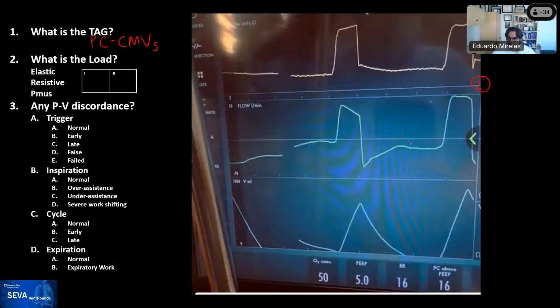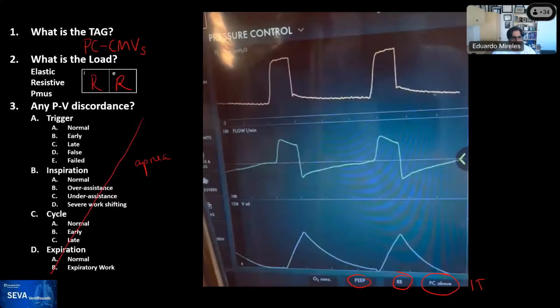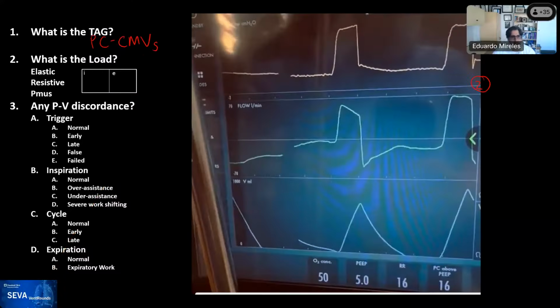So that's correct, Lorenzo and Mohammed and Tim. That's great. This is why I put this sequence here, because it becomes very evident. You have this breath here. It looks similar to the prior ones. The scale changed, because remember that these ventilators adjust the scale automatically. Here the flow was at 100, on the next one at 70, so that's why you see it a little bit higher.